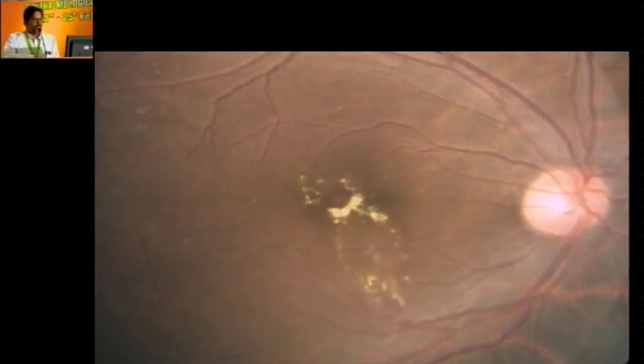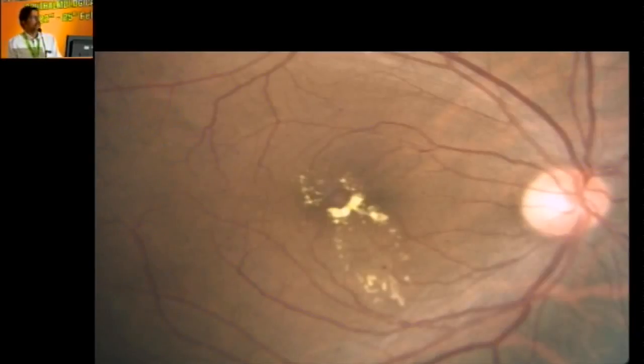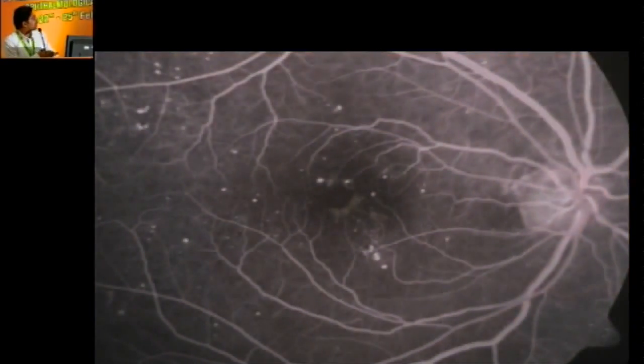You can see that here, the aneurysms which are mainly required, which need to be treated, will be this group of these 2-3 aneurysms here, this aneurysm here, and these aneurysms here. And I can forget about all these aneurysms. So when you do focal laser, we have to target the aneurysms which are causing the edema. So we can try to superimpose. Here you have the edema in this zone, and then look at the angiogram and try to see which are the leaky aneurysms, and rather than hitting the macula indiscriminately, you can just focus on these aneurysms and decide where to put your focal laser.